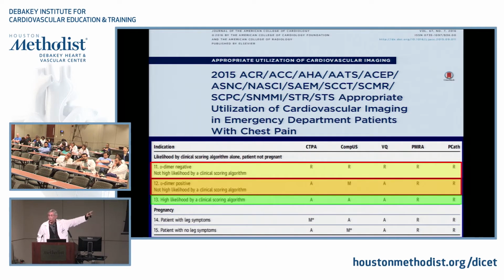And yet we picked up those large pulmonary emboli because, again, clot is about 50 Hounsfield units, 40 to 50 Hounsfield units. So if you have 150 Hounsfield units in the pulmonary artery, you have more than enough attenuation coefficients there to be able to identify a clot. Yeah. So you don't really need to give a lot of extra.